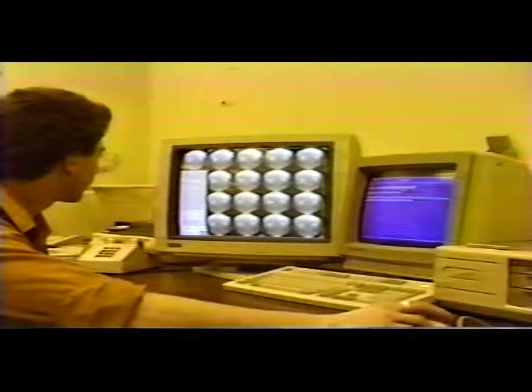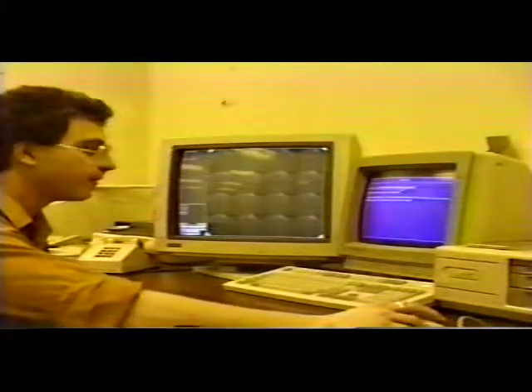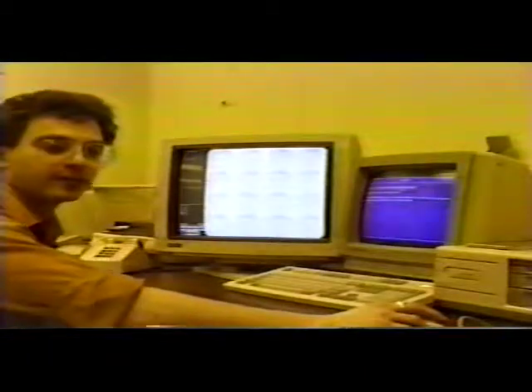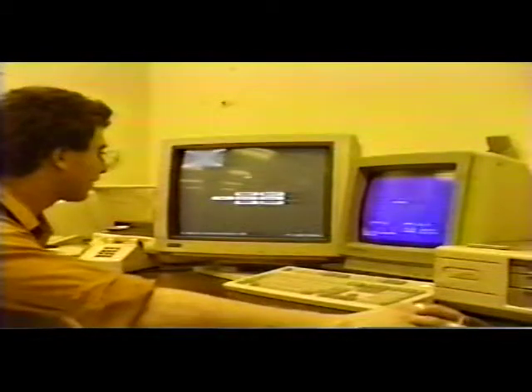If I want to say I'm done with the movie, you put the color map back. There's a flip button that will flip the background. That's pretty fast. I guess it makes more sense with another modality, when we show you X-ray.